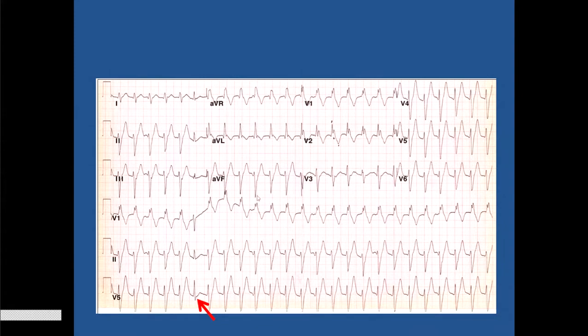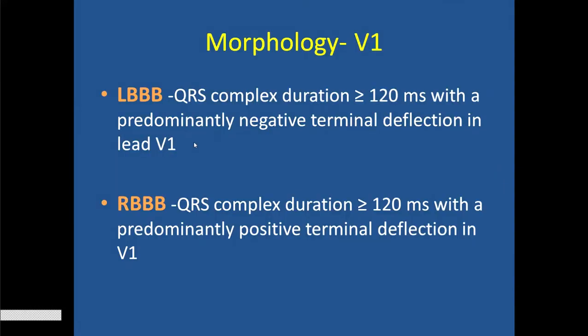For example, this ECG shows a regular monomorphic wide QRS tachycardia, or wideish QRS tachycardia, with RBBB and leftward axis. Now suddenly you see again the sixth beat is a narrow QRS. This is a capture beat. The sinus impulse is able to penetrate and capture through the His-Purkinje system, causing a narrow QRS like the sinus. So this is a capture beat.